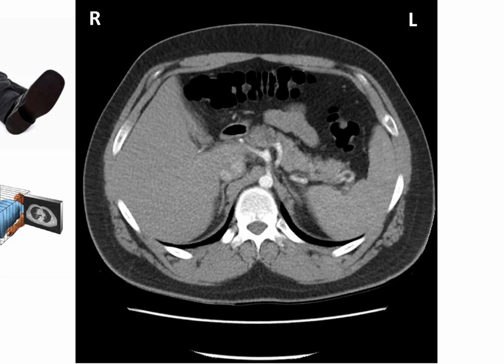We will read this CT starting from inferior and moving superiorly. The inferior limit of our thoracic cavity is the inferior thoracic aperture. Posteriorly, this is at the level of the T12 vertebrae, here. It is articulating with the head of the 12th rib, here, at the costovertebral joint.